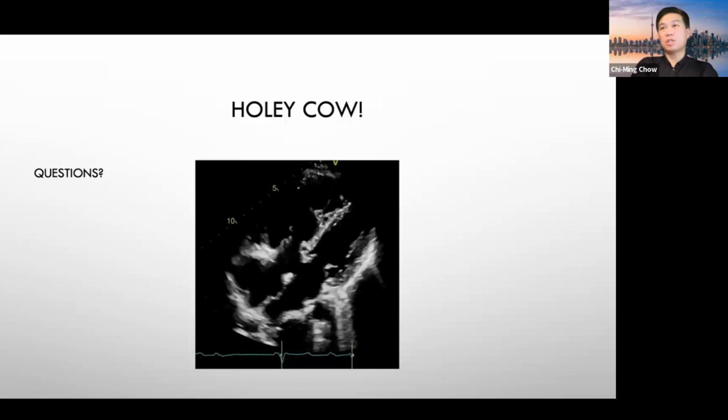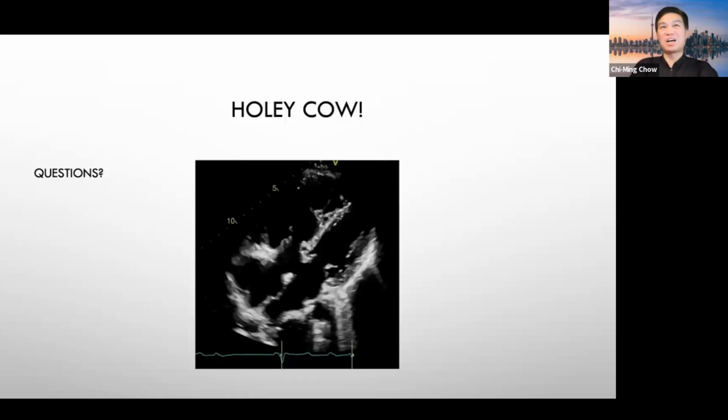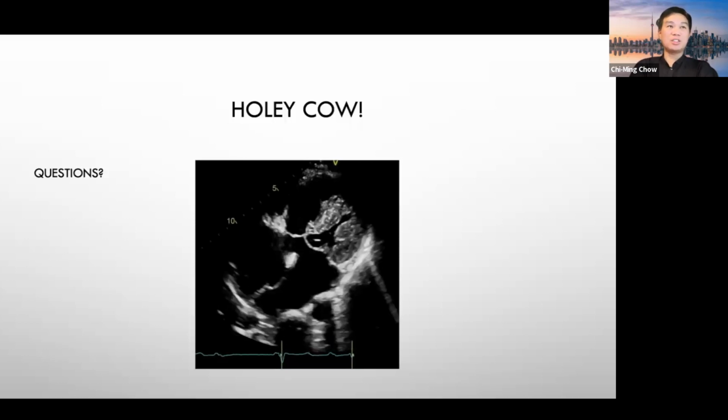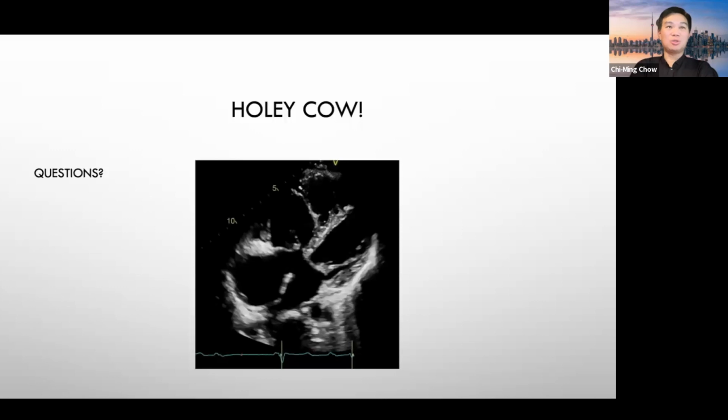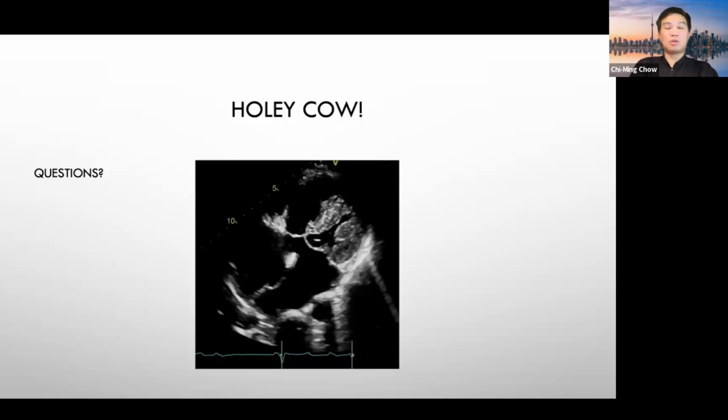I think knowing your physical exam can also be helpful. But not always helpful because it doesn't come with a physical exam unless it's in your own clinic or your own patients. I think we cannot say more than enough about what you have demonstrated about using the bubble study. Bubbles help us to trace the flow, especially agitated saline contrast.